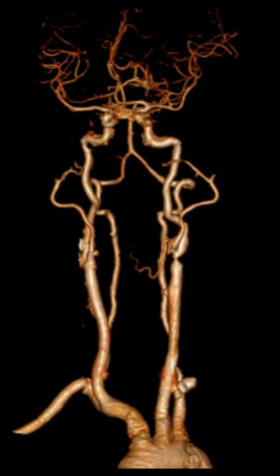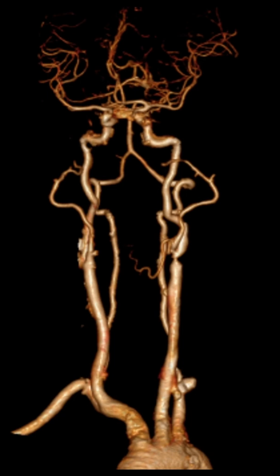The case is of a 60-year-old female. She already had one episode of dysarthria in 2019 and was diagnosed to have a left MCA territory infarct. She also has diabetes and hypertension. CT angiogram was done. Shall we read the CT angiogram? This CT angiogram was done in 2019. Read the CT angiogram. It is an arch of aorta.